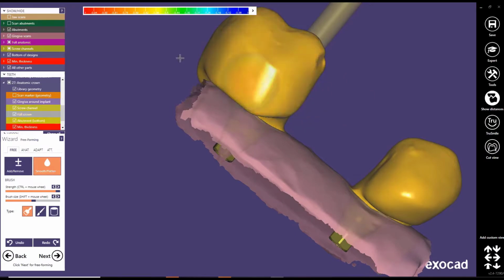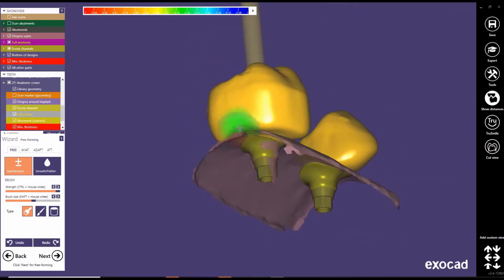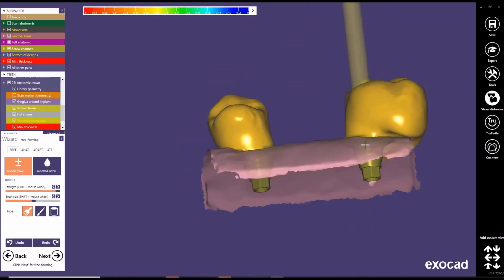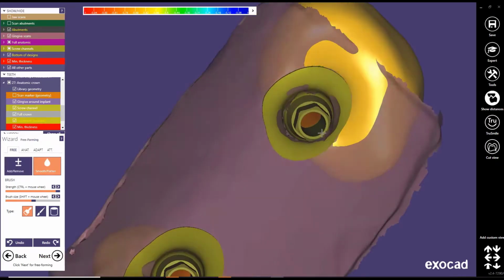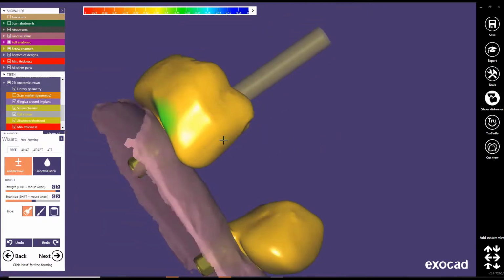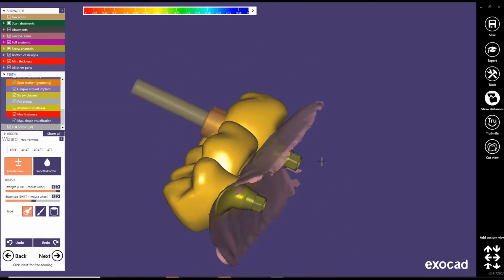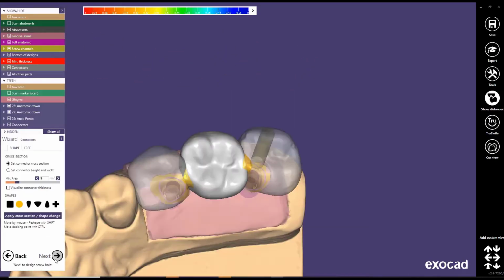And once again, I think this is a nice and useful trick that you can use, especially when it's possible to use the mirror. Okay, let me try to complete this restoration. Once again, sorry for the shape. I know that it is not so beautiful. Okay, I think it can work.